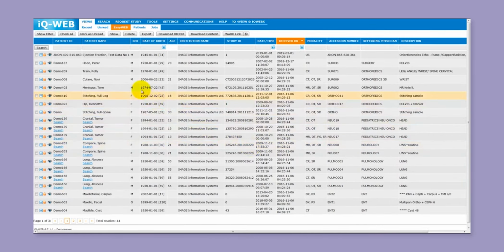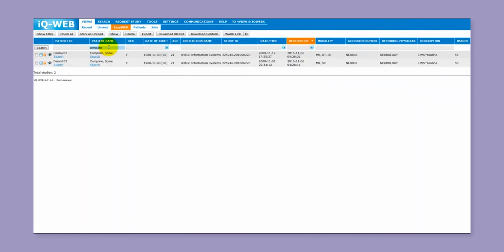To filter studies, use the entry fields above the study list for their self-explanatory search functions. Enter your criteria in a field and press Enter to filter. Press Enter in a cleared field to return to the default view for all studies.